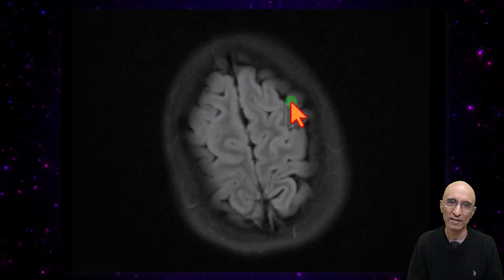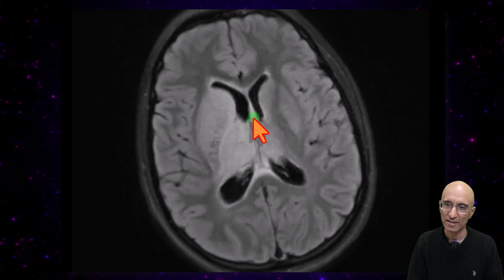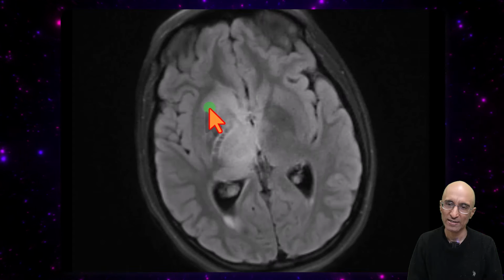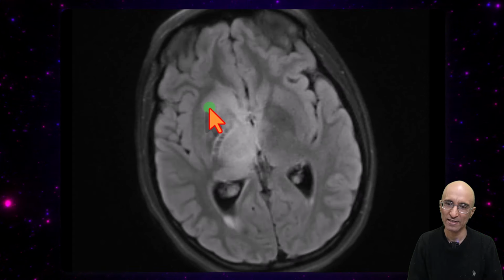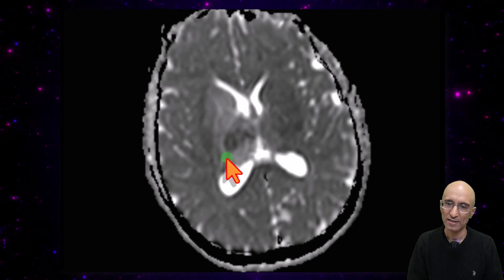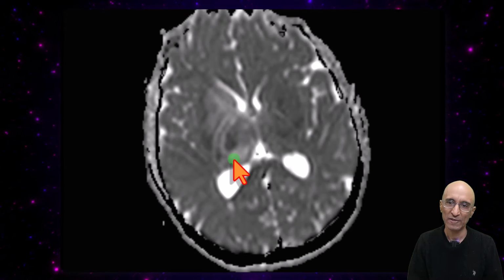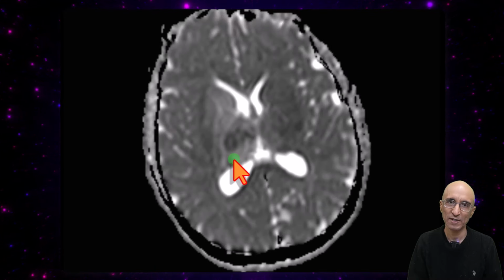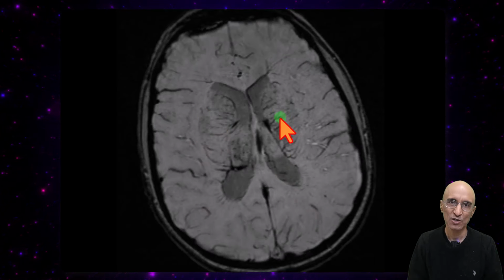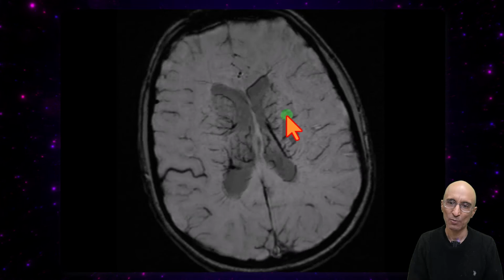The patient subsequently underwent MRI brain examination. On the axial FLAIR images, we can see edema in bilateral thalami, in the caudate nucleus on the right side and lentiform nucleus on the right side. On the axial DWI images, we can see restricted diffusion in the right thalamus. Appearances are consistent with evolving venous infarction and edema. On the axial SWI images, we can see marked congestion of deep medullary veins due to cerebral venous thrombosis.